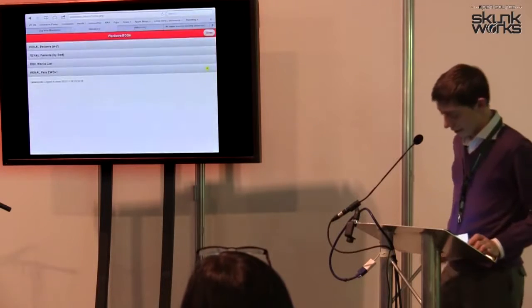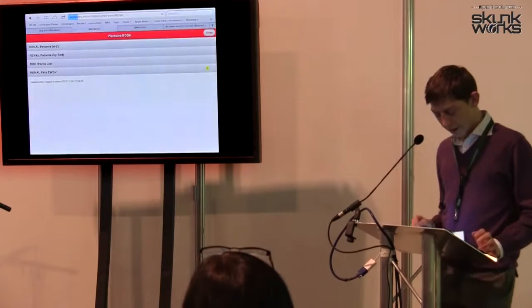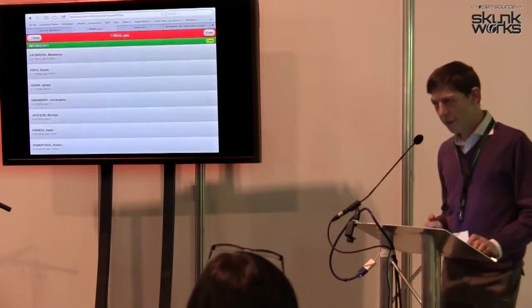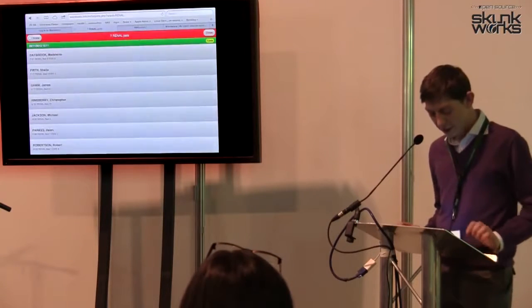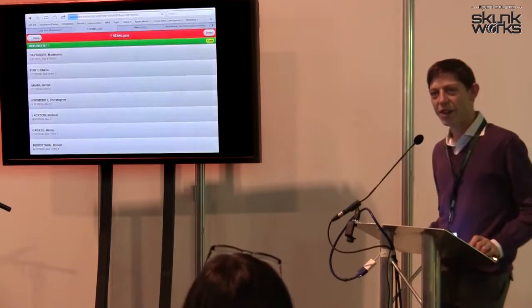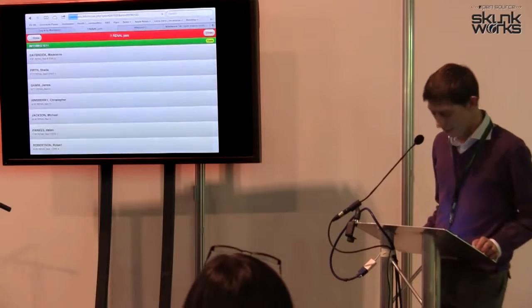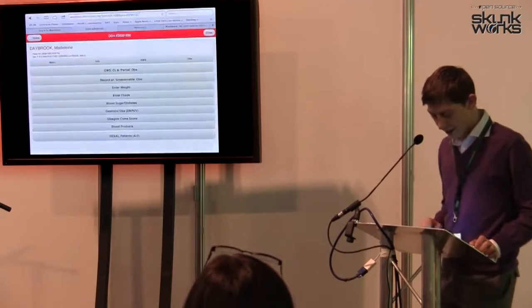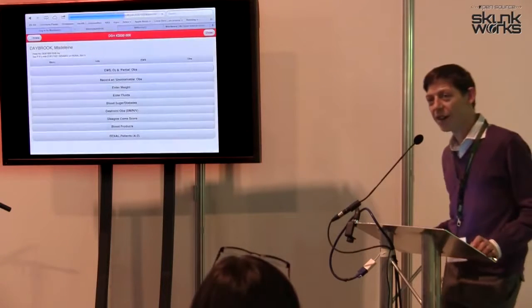So I've been working with one particular patient today. I've done quite a lot of observations, but because I'm not really a clinician, I haven't really been able to make this person particularly ill yet. So if we do have any clinicians here, if they want to shout out some values for this to give us a really high early warning score, then let's do that together as we do the observations. Have we got any clinicians in the audience?